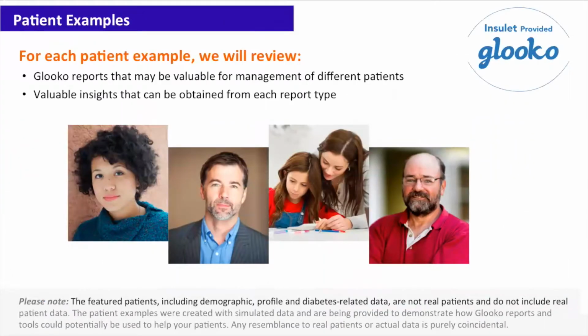Now we're going to take a look at some patient examples and show where Insulet-provided Glooko can help you gain valuable insights for your patient's treatment plan. Please note, this is not real patient data, but simulated data used to paint an example of potential Glooko reports and tools that can be used to help manage your patient.